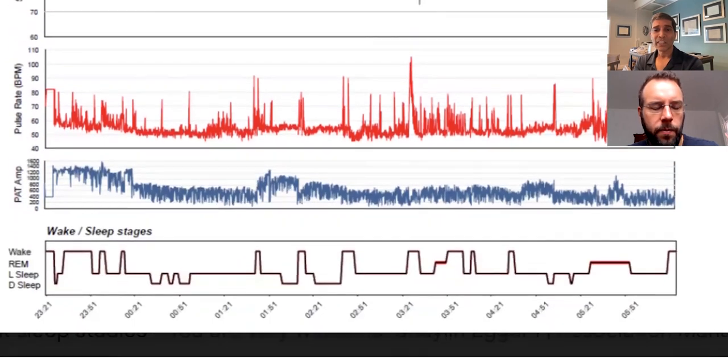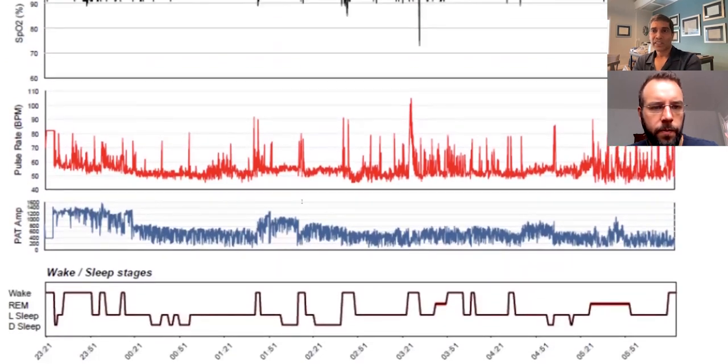And then here's their sleep. Oh my gosh, look at this hypnogram, right? So, light sleep, deep sleep, REM, this is one cycle. A normal cycle is 60 to 90 minutes. And that's crazy. This person didn't achieve their first REM until 4 in the morning, and then cycle 2. So only 2 cycles during the night. That's not normal. We want 4 to 6 cycles.